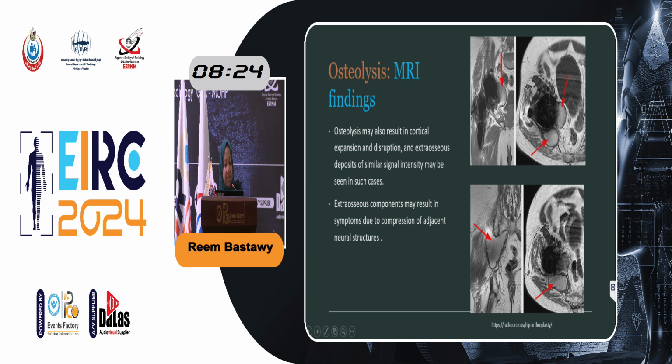Osteolysis may result in cortical disruption and a consequent extra-osseous component which has the same signal intensity as the osseous lesion, slightly hyperintense to the skeletal muscle in T1 and T2 with the characteristic hypointense outlines. And these extra-osseous components can compress adjacent structures, with special importance on the neural structures, like this case presenting with foot drop.